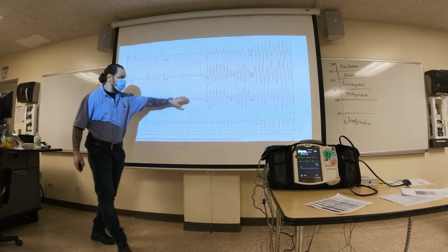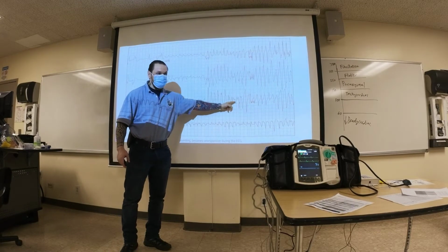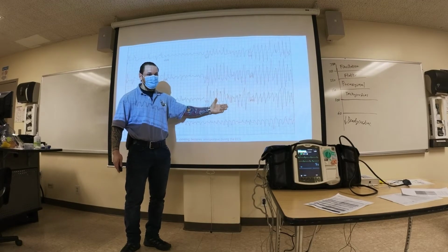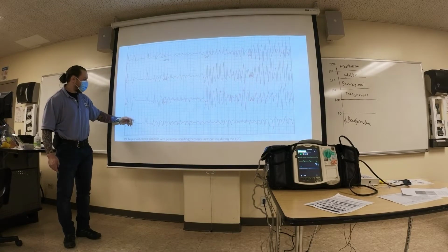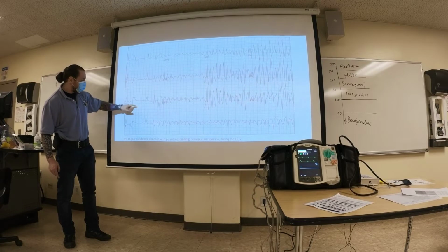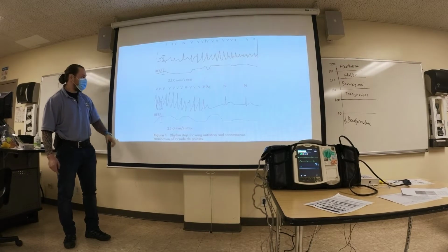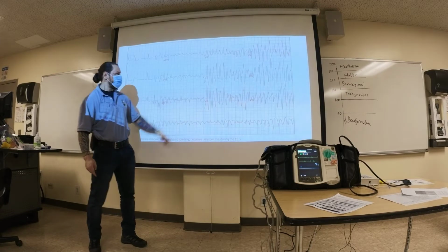When you do a 12 lead, you see these precordial leads. What does this look like? You could see the twisting of the points. So this is a clear-cut polymorphic ventricular tachycardia. Even if you cannot see it on the 12 lead, you know what I notice? There's a prolonged QT interval, and there are some ectopic beats landing on the vulnerable period, like this one here. This is what they call the R-on-T phenomenon.